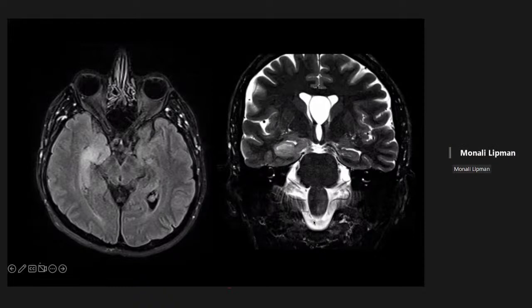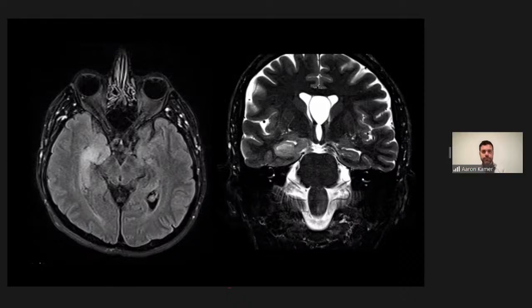Hey, so I think here we're looking at the FLAIR images, and in the right, I guess temporal horn, I'm seeing some increased FLAIR signal, and then on the coronal view, I think the right looks more like we lose the normal architecture.